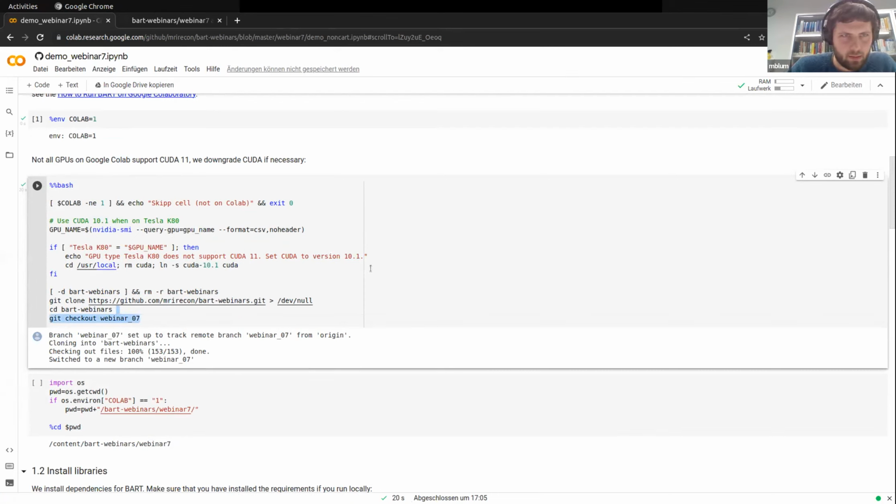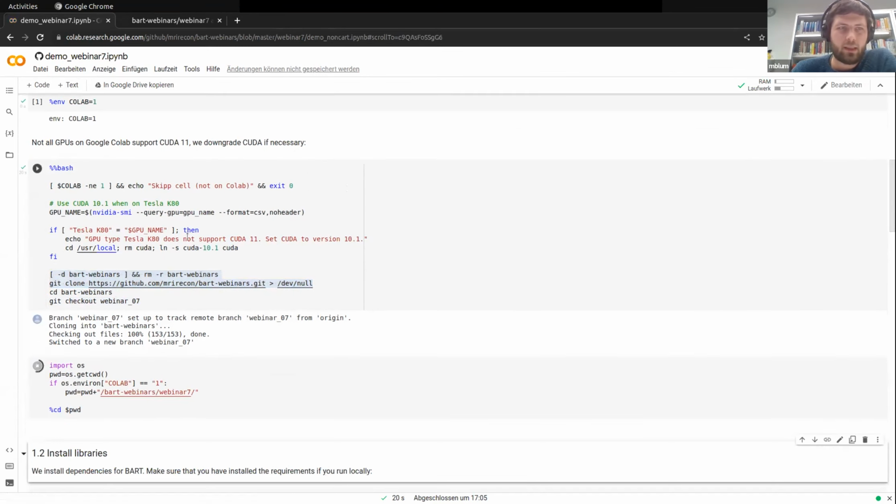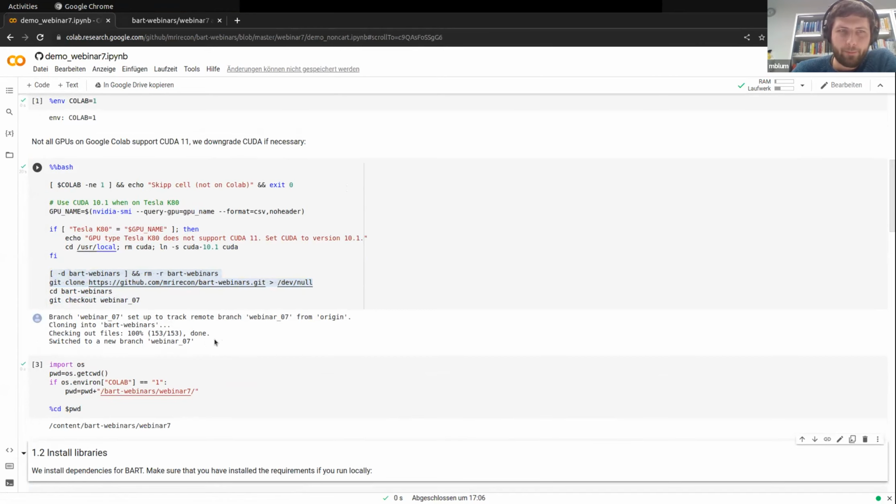You will copy the BART webinar from the GitHub, and we will CD into that if you're on Google Colab. That is to get the data which is uploaded on GitHub.